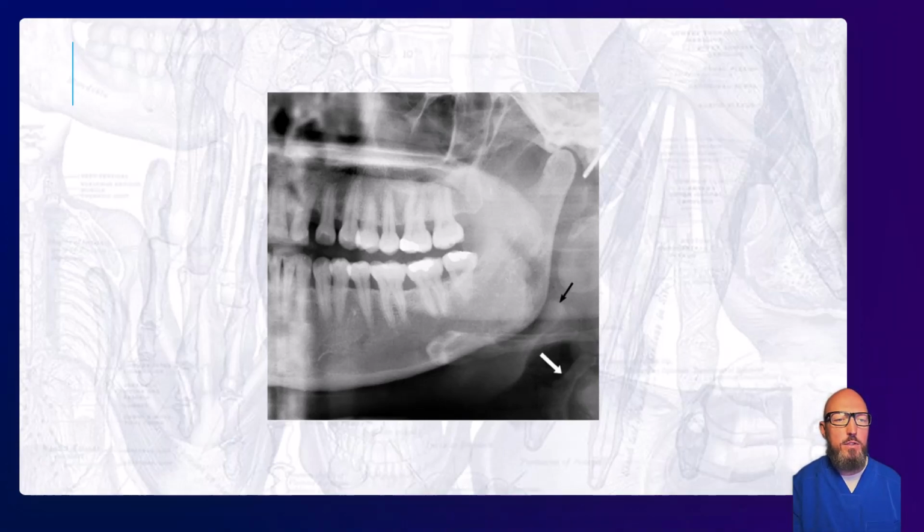I've seen students do that. I've seen experienced dentists do that, but you're never going to see a clavicle on a pano. Hyoid bone up here where it might be captured in the image. Clavicle, not so much. So that's guaranteed wrong if that's a choice on an assessment.